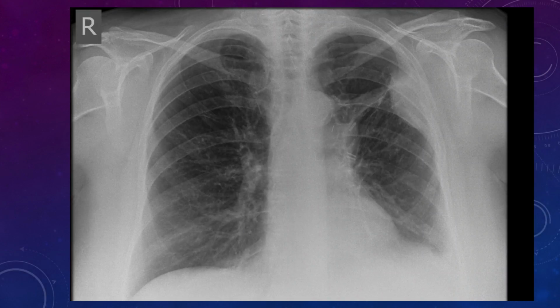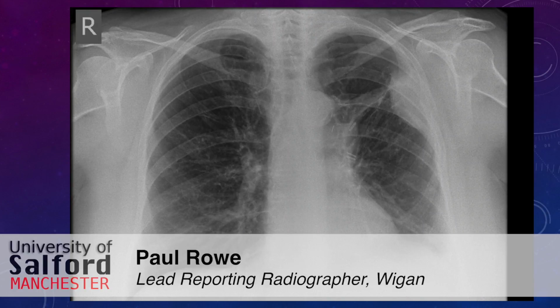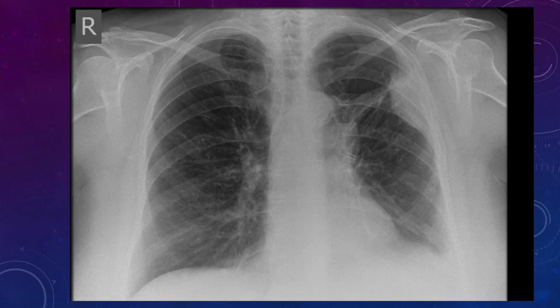Okay, how about this one? You got that on a shoulder film. There are a few clues here. We've got some mediastinal clips. So this patient's had previous surgery.